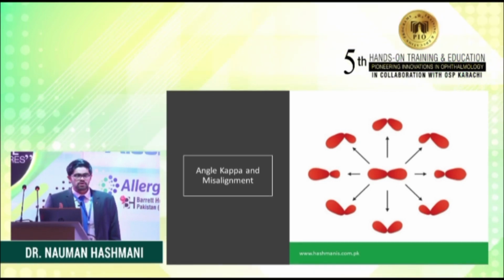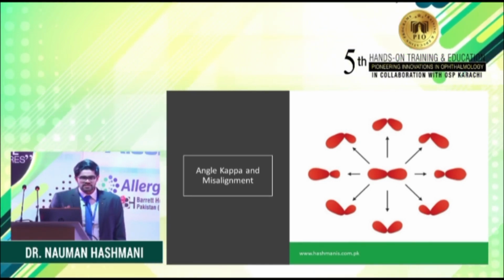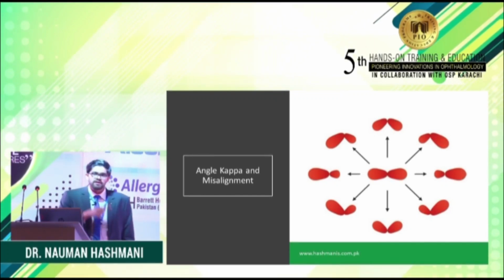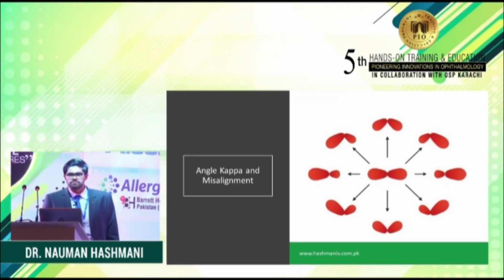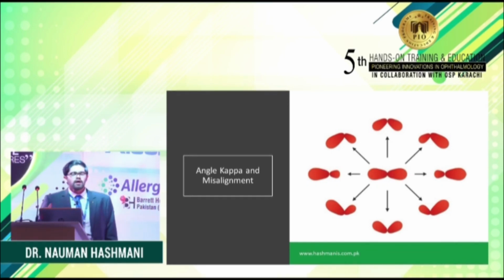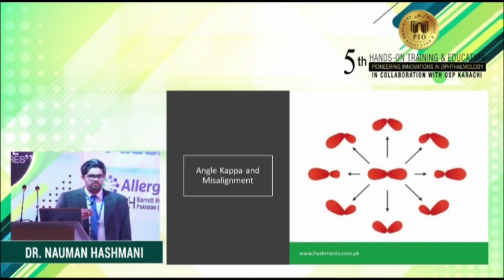So this is very important. Sagittal curvature maps are highly dependent on this, because that is an inherent limitation of the sagittal curvature principle. It has nothing to do with whether you use a topographer or a tomographer. In either one, sagittal curvature is going to be highly dependent on this. Now, tangential curvatures, for whatever reason, are not popular, but they are a lot less dependent on something like this.